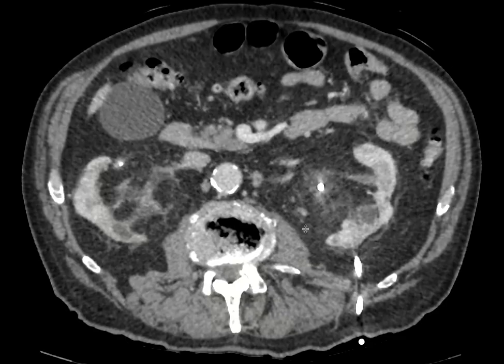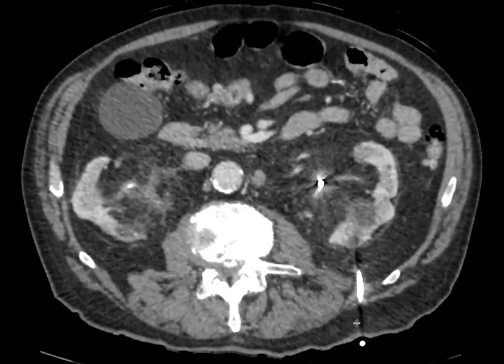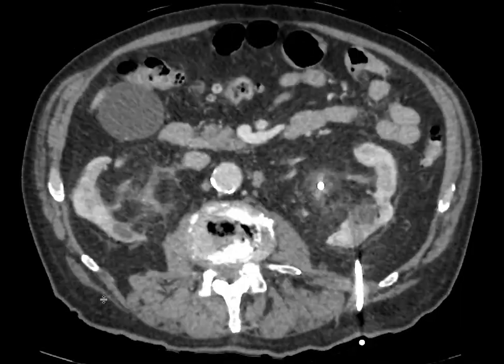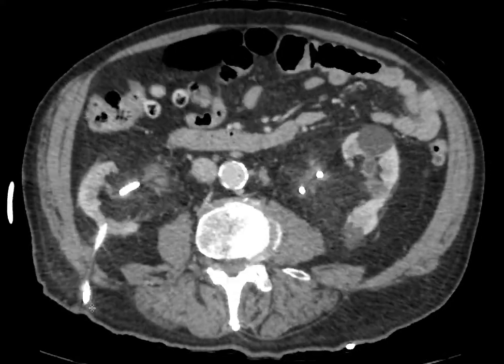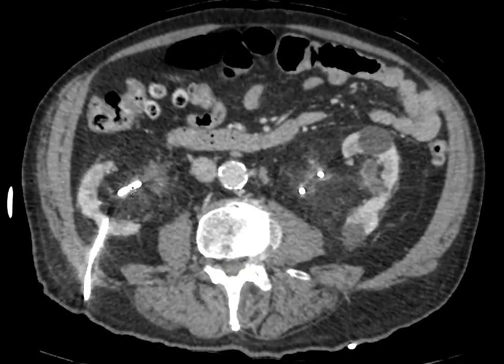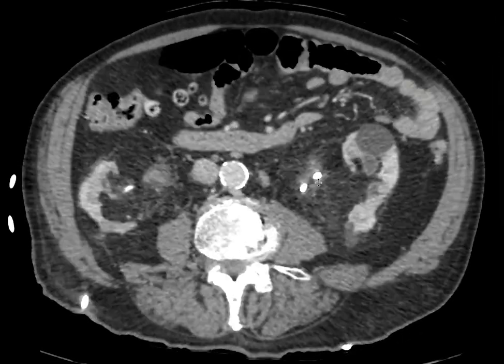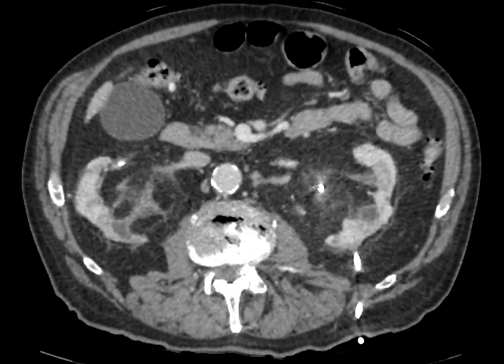Here's a patient who has bilateral nephrostomy tubes. You can see the tubes coming here on the left, and then another tube comes in on the right, and these are percutaneously placed. So these are percutaneous nephrostomy tubes. And the pigtail catheters you can see are looping within the renal sinus bilaterally.